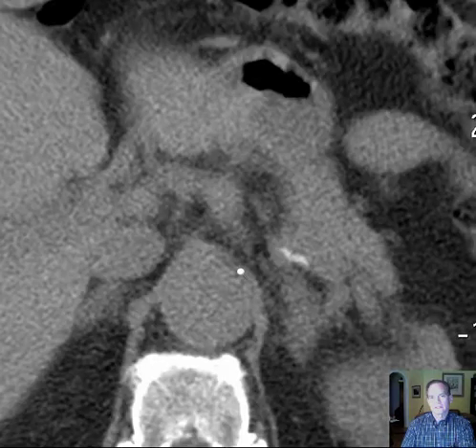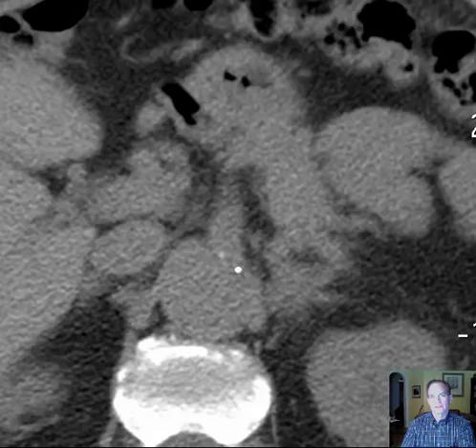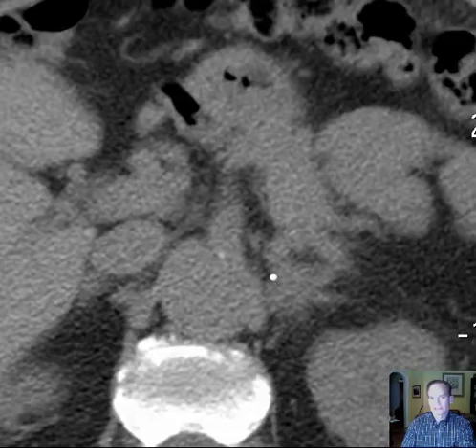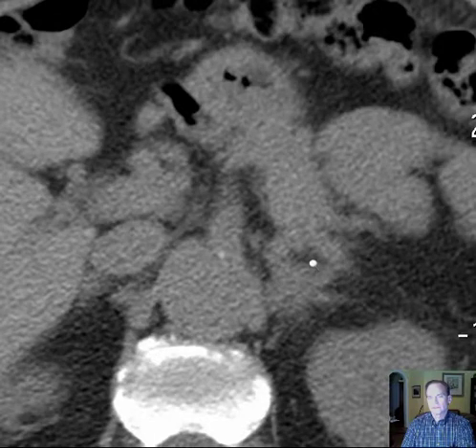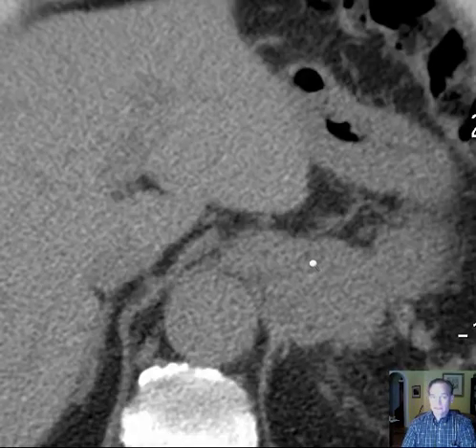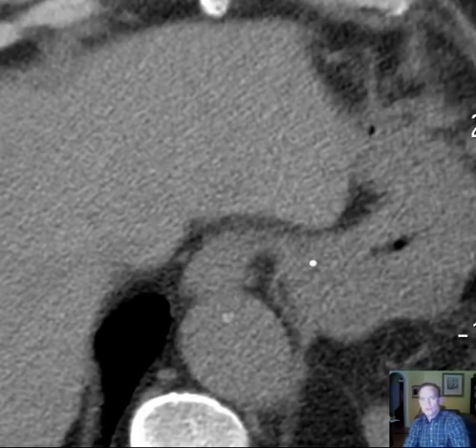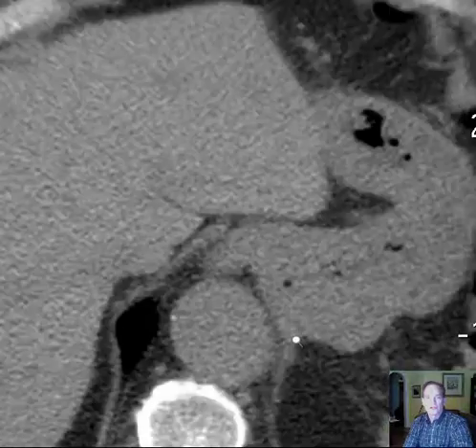That's the celiac artery there, so that's the superior mesenteric artery. That little calcification there is pretty subtle, but seeing the other ones, I feel like that's probably real. So they all suggest that the calcifications of the arteries, some of them are displaced. Where are the calcifications located? They are intimal calcifications in the intima, the innermost lining of the arteries.